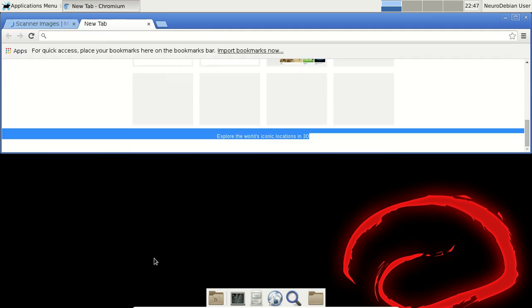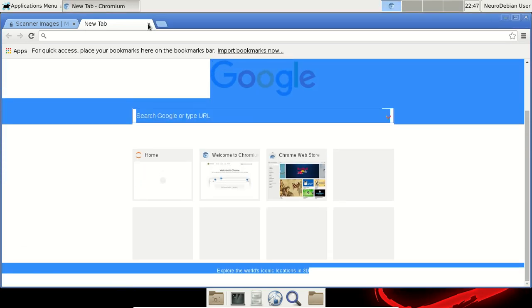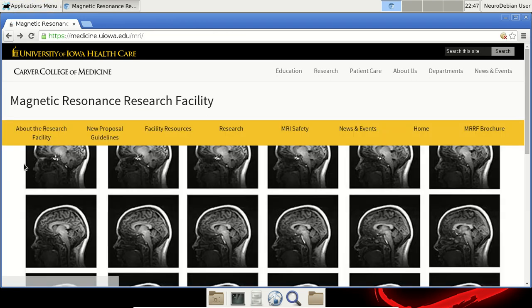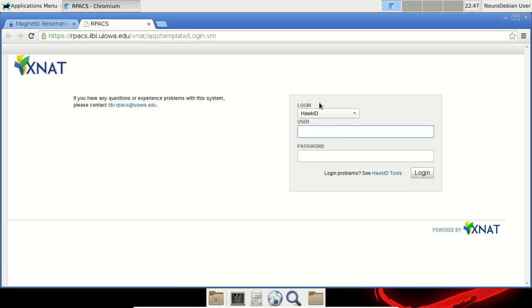There we go, finally. So go back here. Now on the main page, we're going to click on the XNAT login.